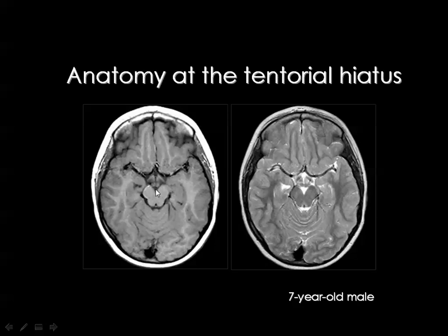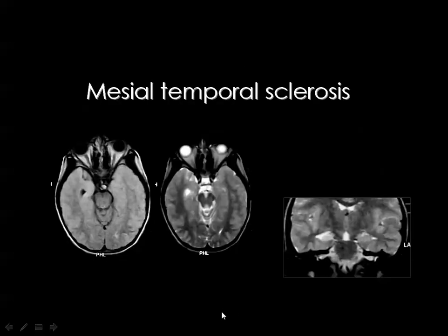This area is known as the interpeduncular cistern, and in this cistern you see two very small bodies adjacent to each other, and these are the mammillary bodies. You can see them very well here, and this line represents the optic tract, and this also represents the optic tract. Then this is the interpeduncular cistern between the left and right cerebral peduncles. In the interpeduncular cistern you can see the mammillary bodies.